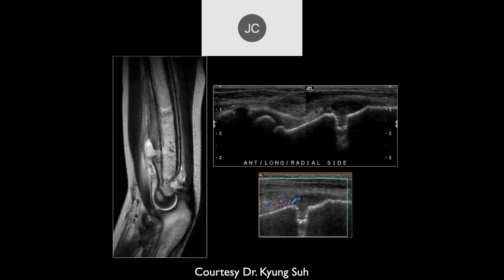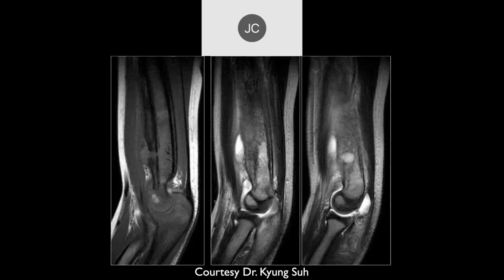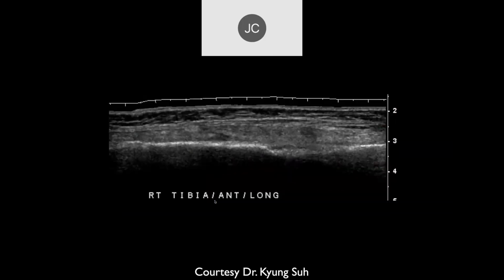And here's an MR scan shot, and here's an ultrasound shot. On the ultrasound, I think we see a fluid collection with a sinus tract going into the bone. You can see it similarly here on the MR, right? Some more images. Fragmentation of the bone looks like a fluid collection going into the bone, or it could be coming out of the bone. Okay, and then there we go. So your thoughts here on this? Be worried about an abscess.